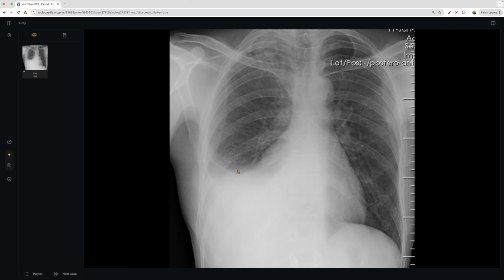And this is the meniscus sign, right? This indicates that there's a pleural effusion. There's some kind of fluid. Now, we can't necessarily measure it or anything like that. Maybe somewhere in a textbook you can draw a bunch of arrows and do trigonometry or something, but that's beyond me.